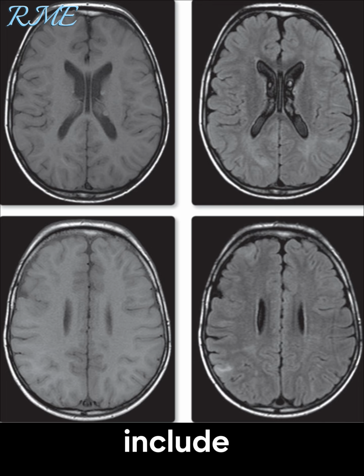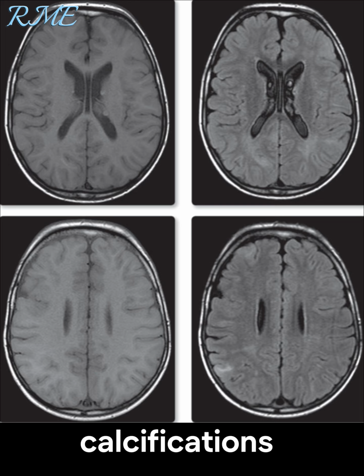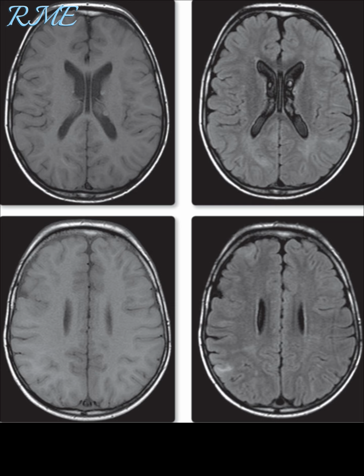Inflammatory causes include sarcoidosis with leptomeningeal, periventricular, pituitary, or pontine calcifications, and systemic lupus erythematosus with calcifications in the basal ganglia or cerebellum. Infective inflammatory causes may be congenital, such as TORCH infections with periventricular and/or subependymal calcifications, which may resolve with treatment in the case of toxoplasmosis, or congenital HIV with periventricular frontal or cerebellar calcifications.